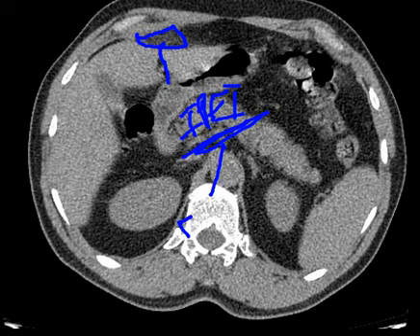One is epiploic appendagitis, which is usually less than 4 centimeter, and epiploic appendages are part of the colon. They get twisted, and due to ischemia, infarction occurs. And the second term is omental infarct, which is usually the infarction of the omentum. It is usually more than 4 centimeter. So we can use a broad term, which is intraperitoneal fat infarction.